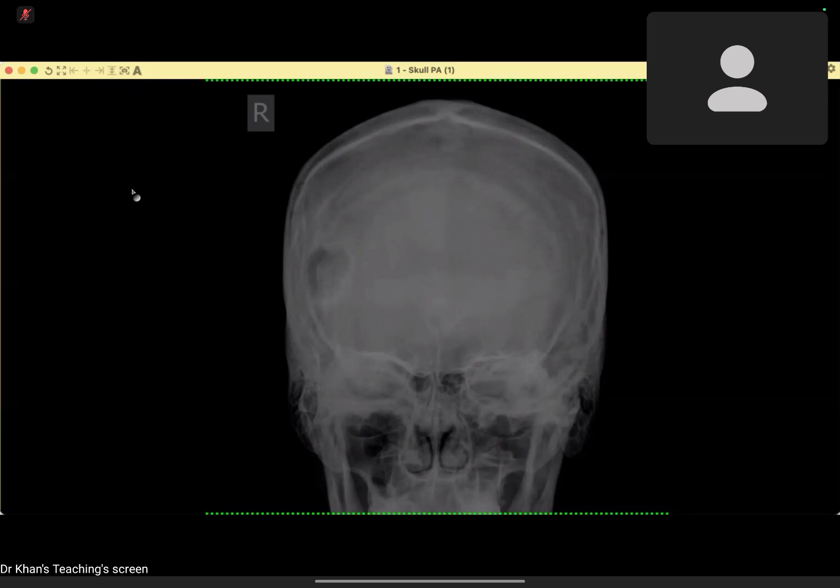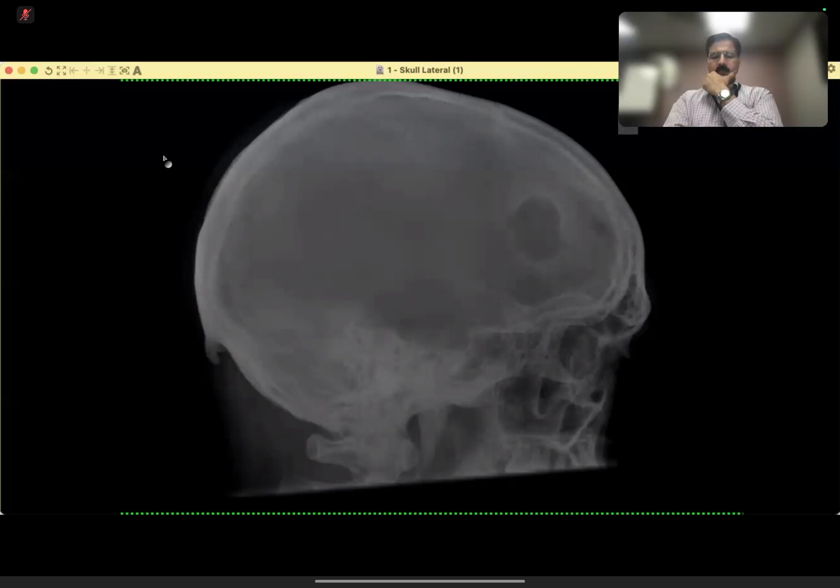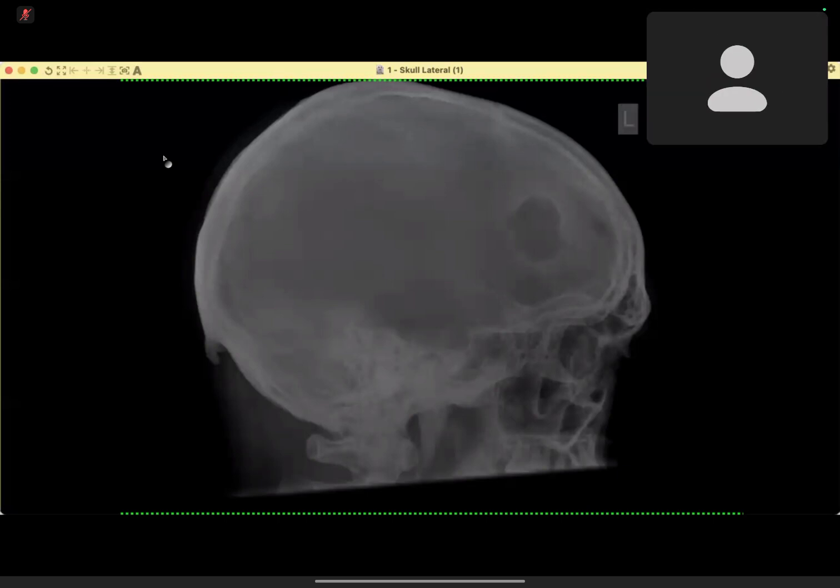Other, it could be a bony lesion due to the changes of Langerhans cell histiocytosis. Also, this is an adult patient for this diagnosis. It could be due to metastasis. So I will check if there is any history of primary tumor elsewhere. There is no history of metastasis.